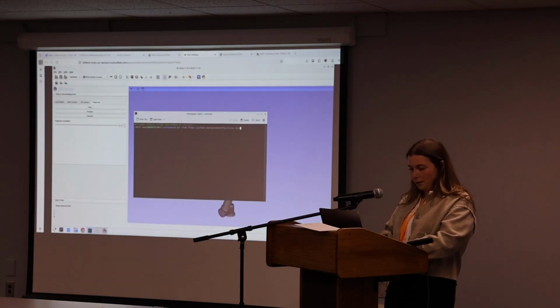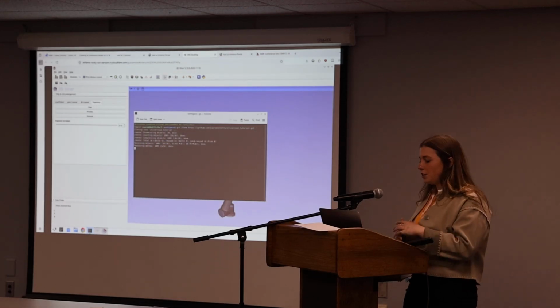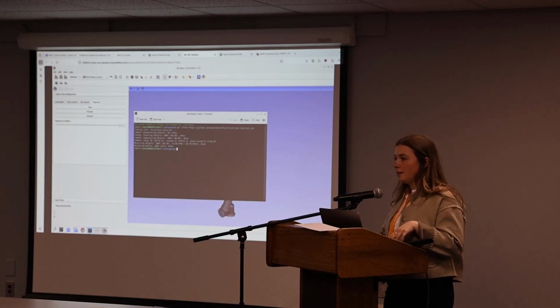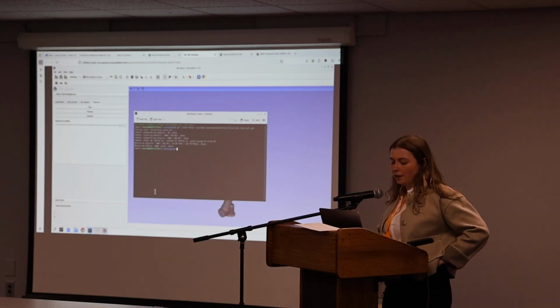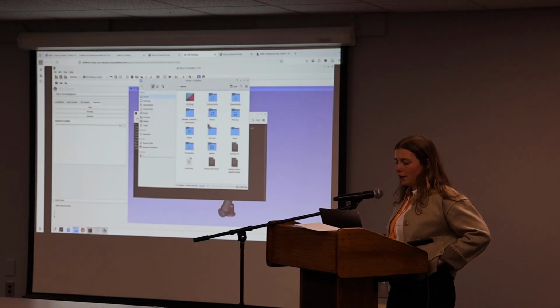Yes. This is just to get some data that we're going to load into the scene. Hopefully that's working for you. You can check quickly by opening a file explorer, and it should be in your home folder.